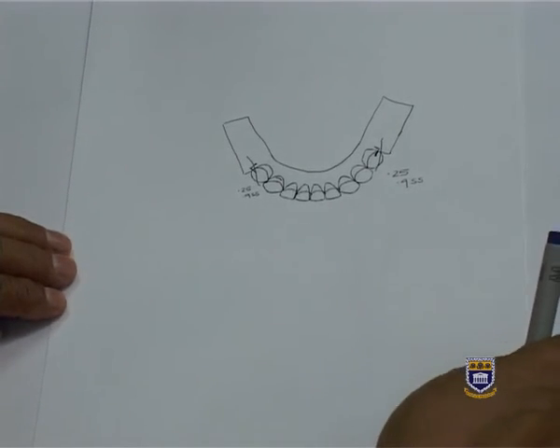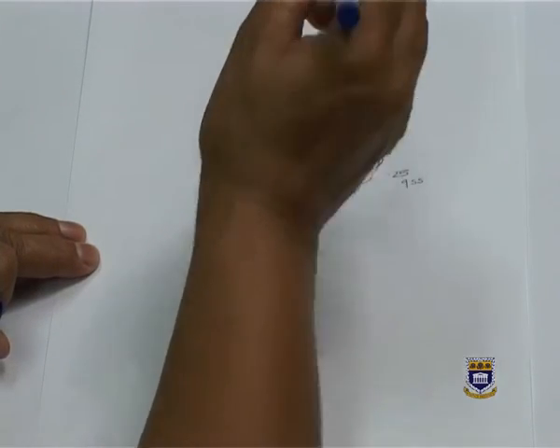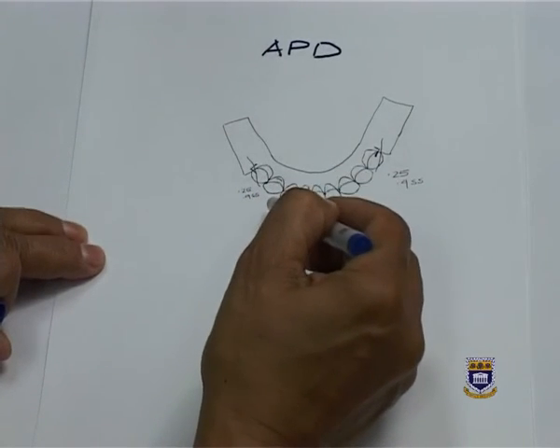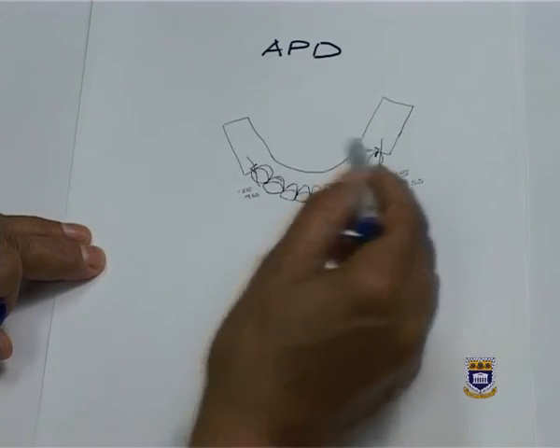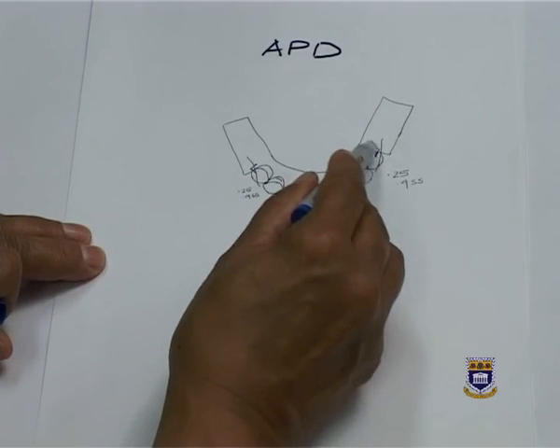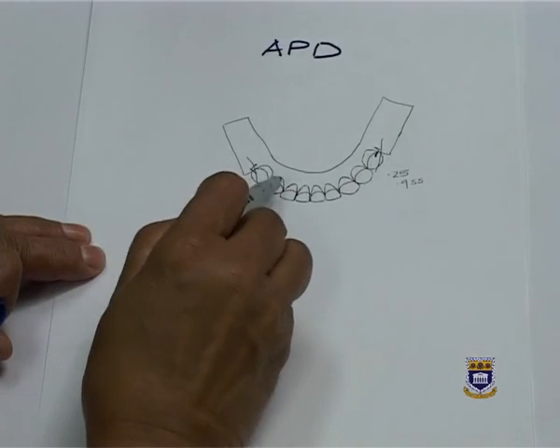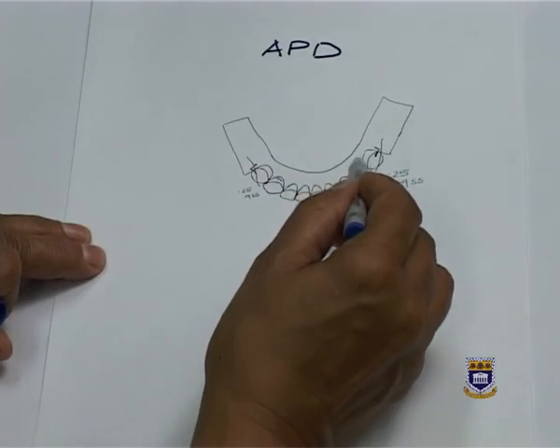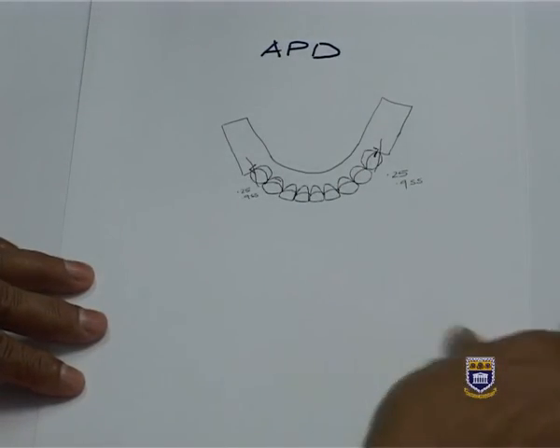An acrylic partial denture. This will be an acrylic partial denture again. Here I'm covering all the teeth because acrylic needs bulk for strength. I'm using a C clasp on the abutment teeth, on the premolar, the 3-4, 3-5, as well as the 4-4. I've used a distal occlusal rest made of half round wire, and I've got my 1, 2, 3 rests. So for an acrylic partial denture, I have to cover all the teeth. I do not have the choice of lingual bars.